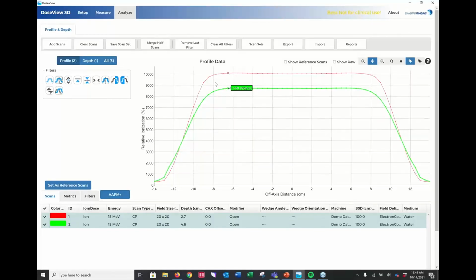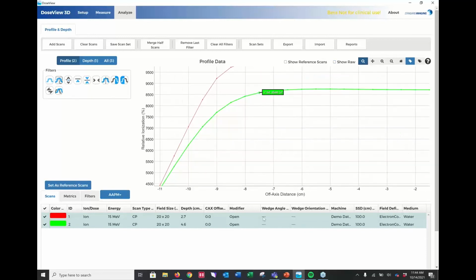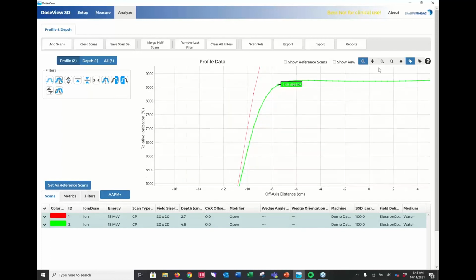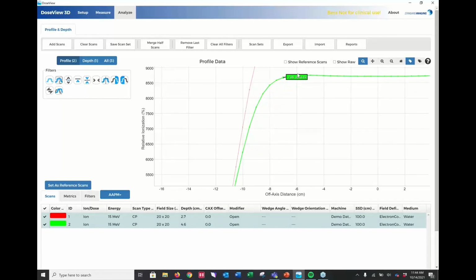So that's kind of a quick overview. One last thing, you have the ability here to do magnification and check in on areas. If I want to check in on a specific region of a scan and zoom in on that, I can do that either with a click and hold, or I can also just click my zoom in and it will zoom in a different percentage there.